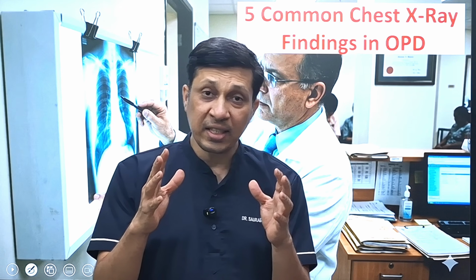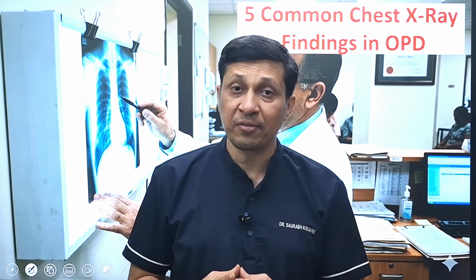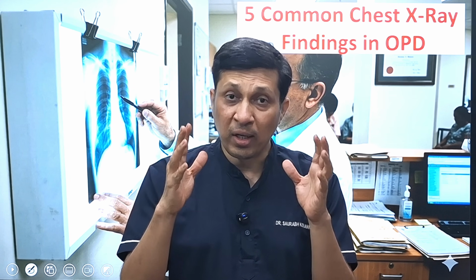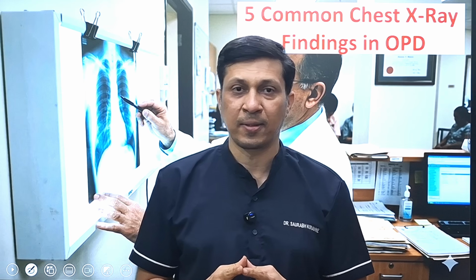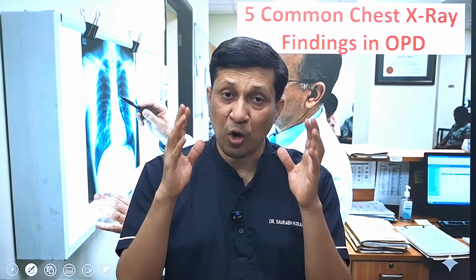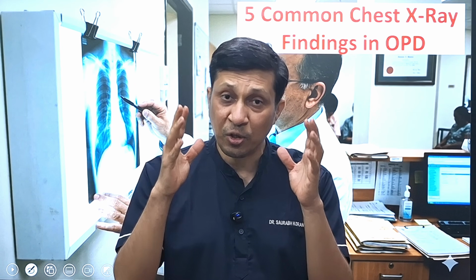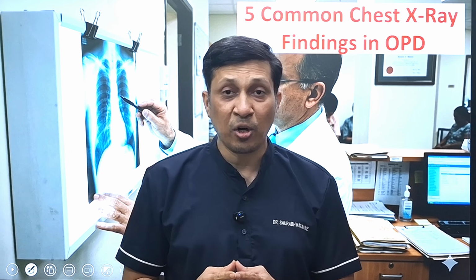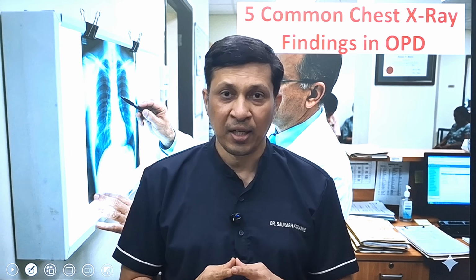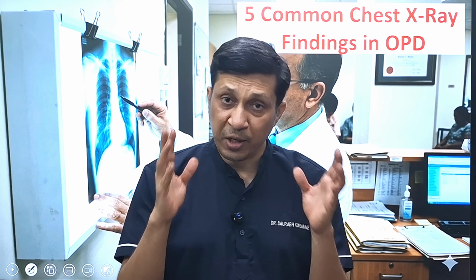Though X-ray chest is one of the most commonly ordered investigations in the OPD, it is the one that is most poorly interpreted by beginners. In today's video, I am going to tell you the 5 most common X-ray chest findings in the OPD that every young doctor should be able to interpret clinically and confidently.